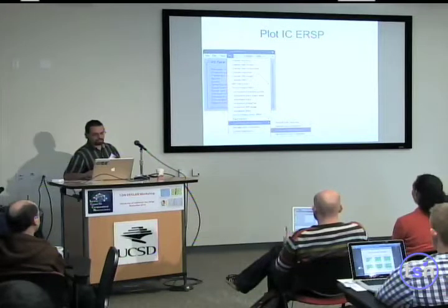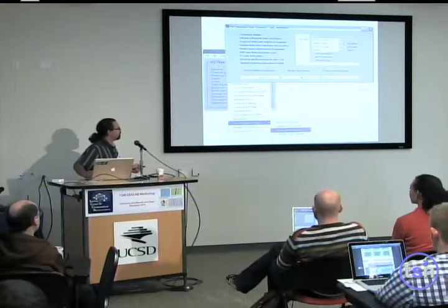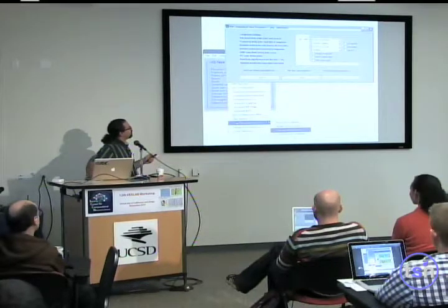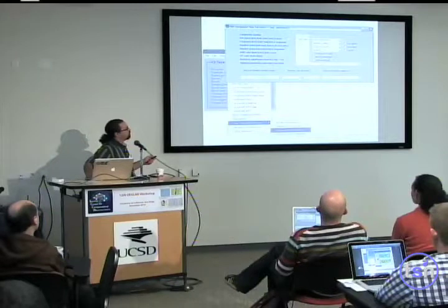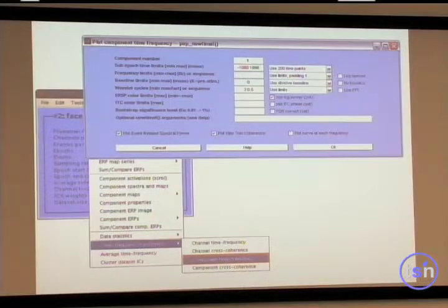Now the last method is the graphic interface where you would plot the time frequency transform. You select your channel or component, the time limits you want, and the number of points you want. You can do frequency padding like we were talking about before. You can use divisive baseline or additive baseline, visualize in dB or in absolute values, and use FFT or wavelets, etc.